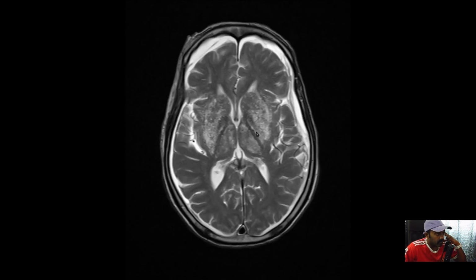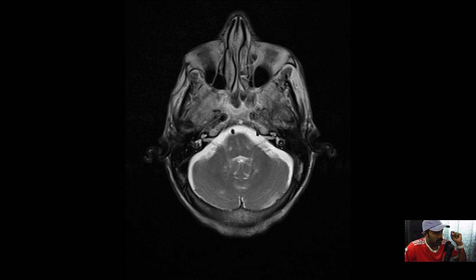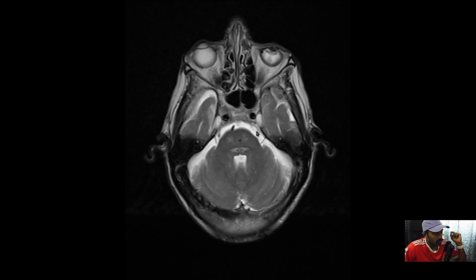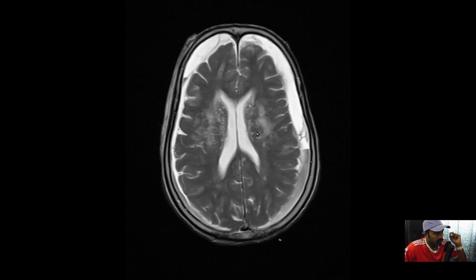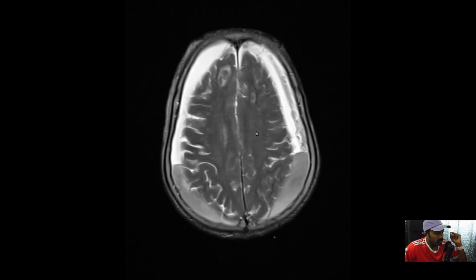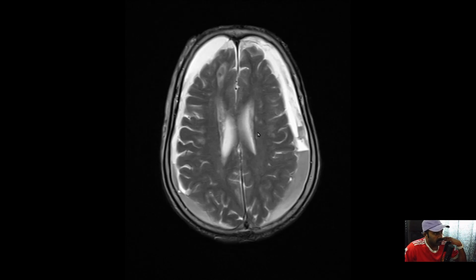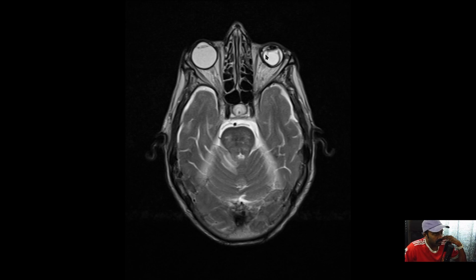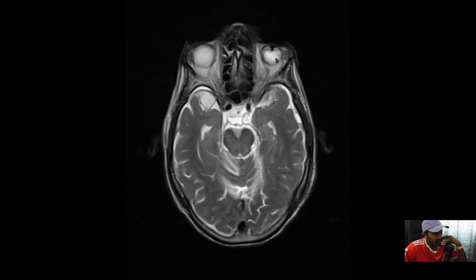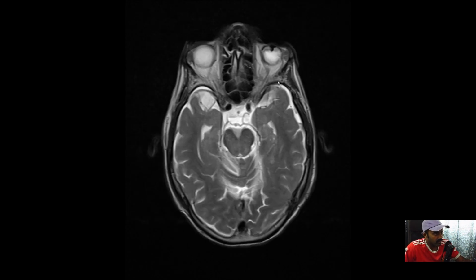And always look for small aneurysms in the angiogram, which could be the etiology for the sort of innocuous intracranial bleeds. And don't forget to look at the periphery of the image for other findings, not probably relevant at this point for the indication, but it's good to document them as well.